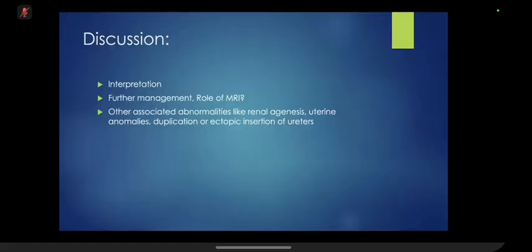Okay. So very good, candidate number 3. Interpretation is very important. Why? Because whenever you are going to perform any cystourethrogram studies, you need to have a very clear knowledge where the catheter is being placed, and if you see any other abnormal contrast opacification, then it means that the baby might be having fistulous communication. It could be with the bowel, it could be with the bladder, and it could be between the bladder and the vagina. It could be within the ureter even.